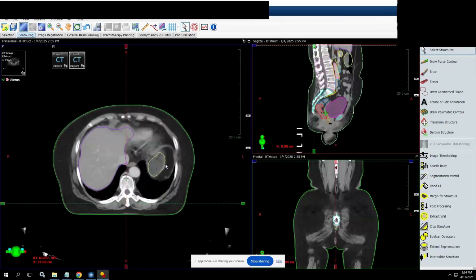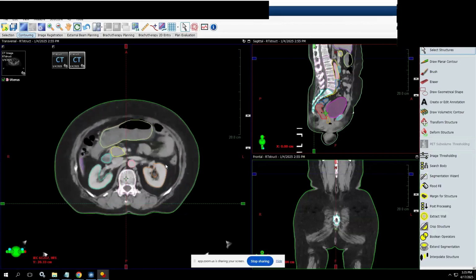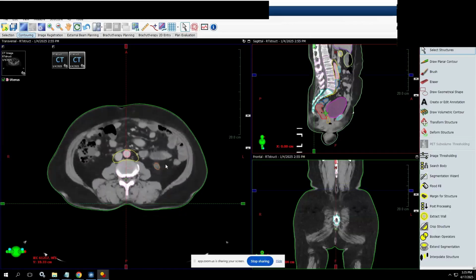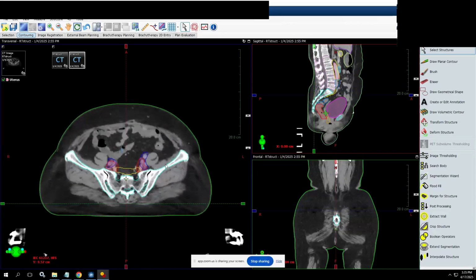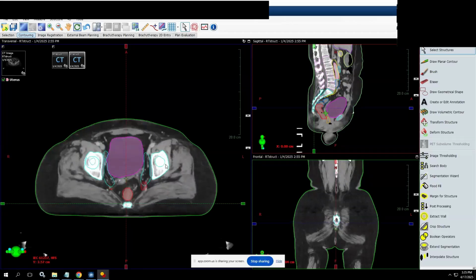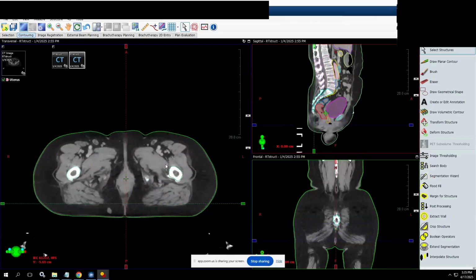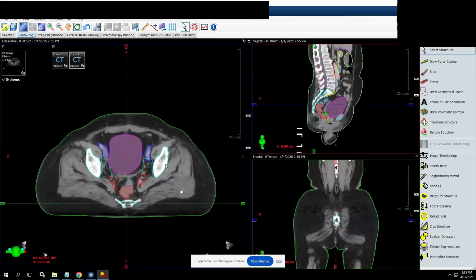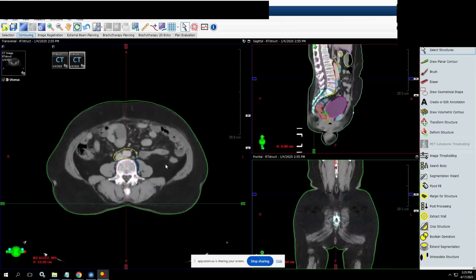This is the segmentation of gynae cases. Now this model was quite interesting because we only did this training with a very few number of cases. And you can see that the performance in terms of segmentation of the para-aortic nodal region, kidneys, abdominal organs, etc. are quite reasonable. Here we are highlighting the possibility of nodal substructure solutions, and here external iliac, internal iliac, obturator nodal volumes have been separately drawn. Again this shows how flexible our model is. So we can accommodate different types of guidelines and different types of requirements for your model segmentation needs.